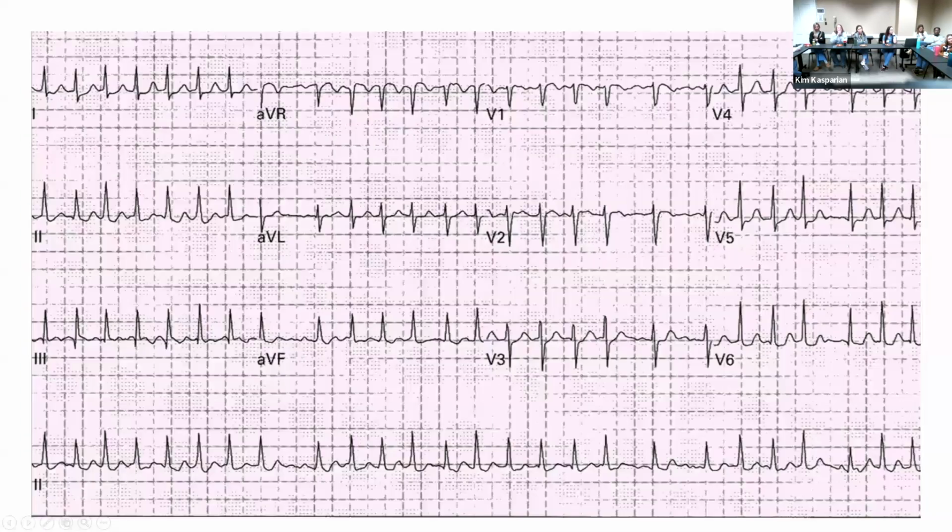All right. Go for it, man. So I want to try to do the rate first. I'm just gonna ballpark that one around 120 without trying to do the math.